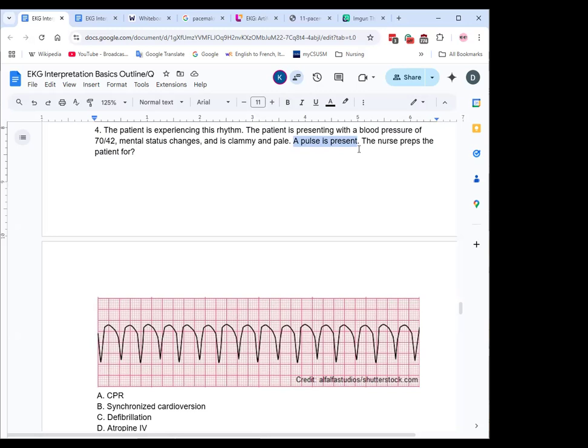Yeah, this one's a sustained monomorphic VTach. Again, you don't need to know all that detail. Don't worry about it. But for VTach, the typical presentation is what you can call a sawtooth or the tombstone. It looks like a bunch of tombstones because they're about to die.